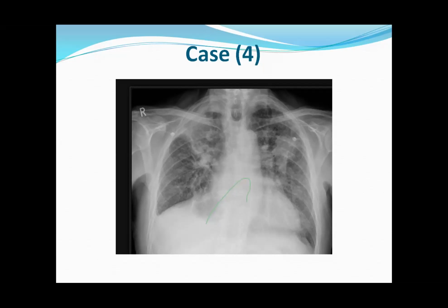So I would like to know if the patient has any occupational exposure to dust, silica dust. I would like to put it under pneumoconiosis, and the patient would require a CT chest for confirmation of diagnosis. My first differential diagnosis would be pneumoconiosis with progressive massive fibrosis.